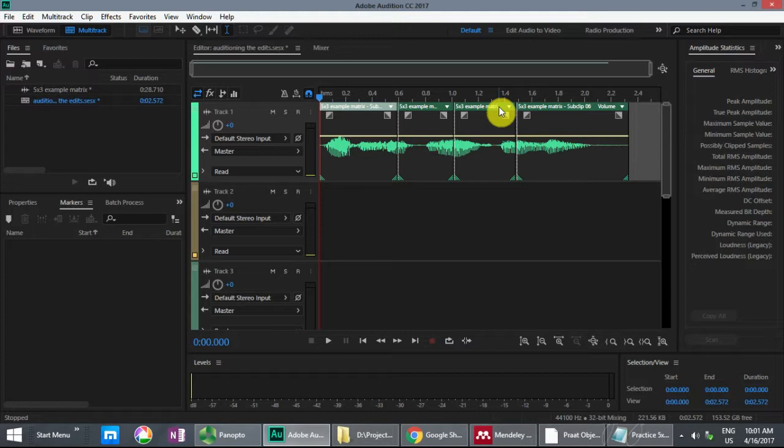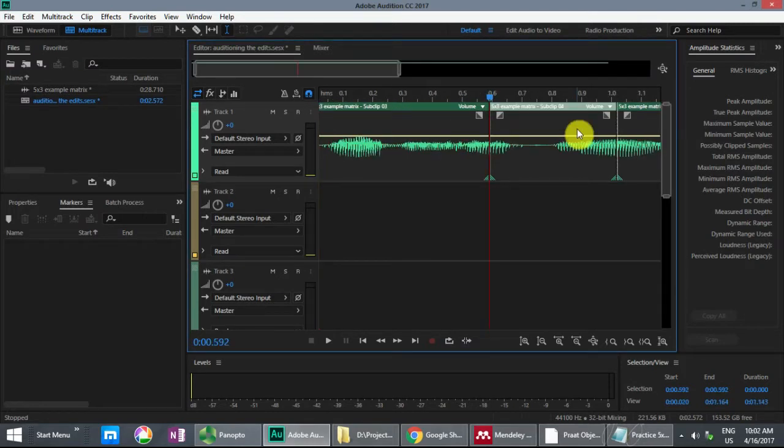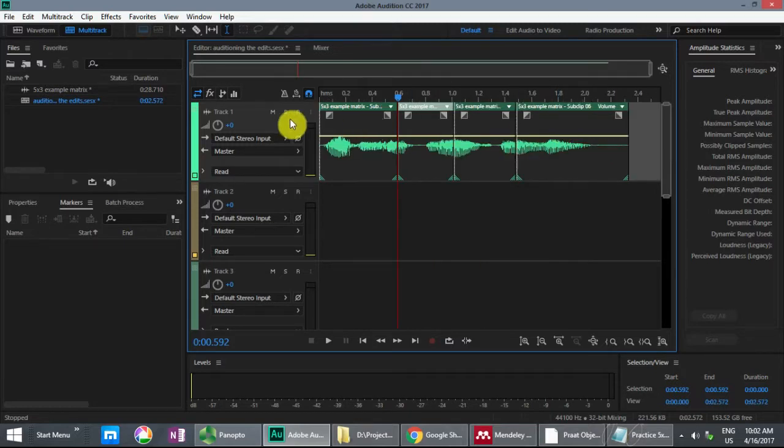The reason that's happening is because we did not edit at 0 crossings, and we did not overlap these segments. Later on, we will be applying 35 millisecond ramps or fades to each of these in order to smooth out those clicks. But for the purposes of auditioning, you just want to hear a nice flow to the sentence. Sounds natural, with the exception of that click.